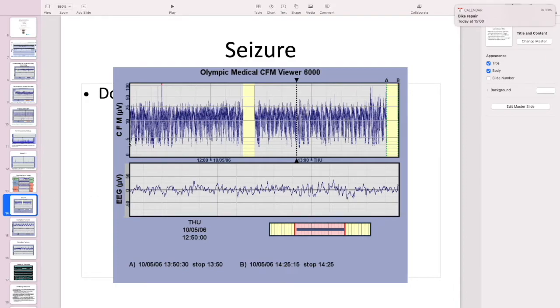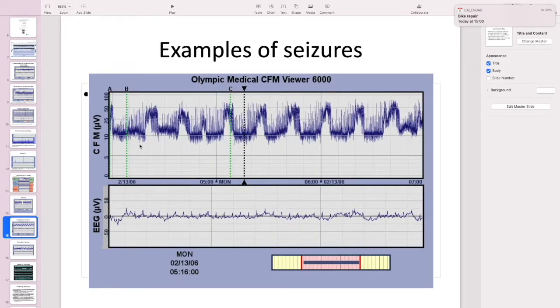So actually, if you just looked at the values, the lower border's just above 5, I'd say, around 5, so not too bad. Upper border's well above 10, but actually you get these spikes, you get cutouts almost like in a pyramid tent-like fashion, like this, cut out, and then the amplitude's quite high here. And if you looked at that time period, or for example this time period, you see this regular rhythmical activity, which would suggest seizures. Here's a more obvious example.